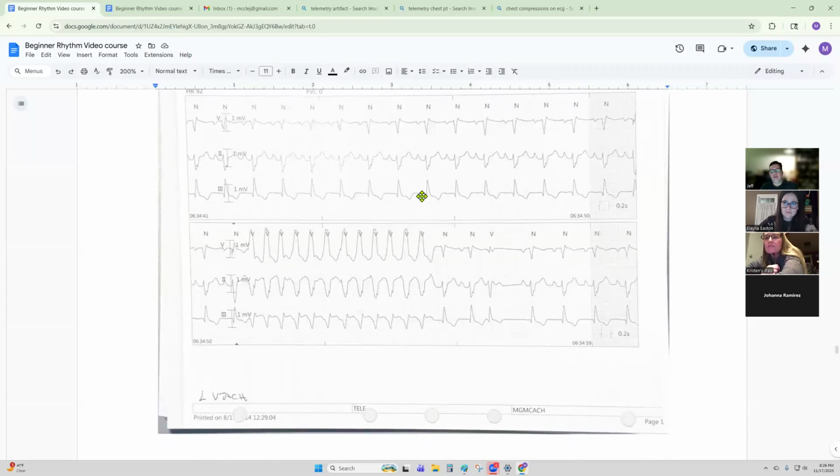There should never be an irregular VTAC, because R is irregular because it's usually responding to the irregular nature of the atrial chamber, right? If the patient's in AFib, you're going to have irregular R. Now, saying that, can there be a heart rate fluctuation where the VTAC starts out a little slower at 120 and then picks up to 150?